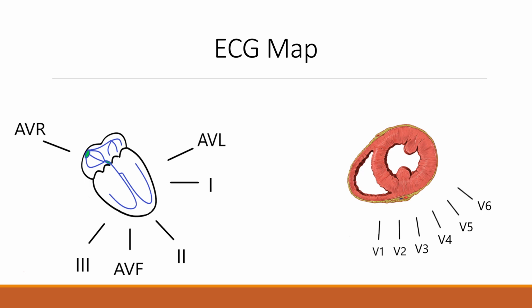And so they give you a different view. And so if you do a true 12 lead, you're really getting almost a 3-dimensional picture by looking at the vertical plane with your hexaxial leads and then looking at the horizontal plane with your precordials. There is no up and down in this case with your precordials. There's just front, back, and then right and left. And so the same concepts and the same things occur.